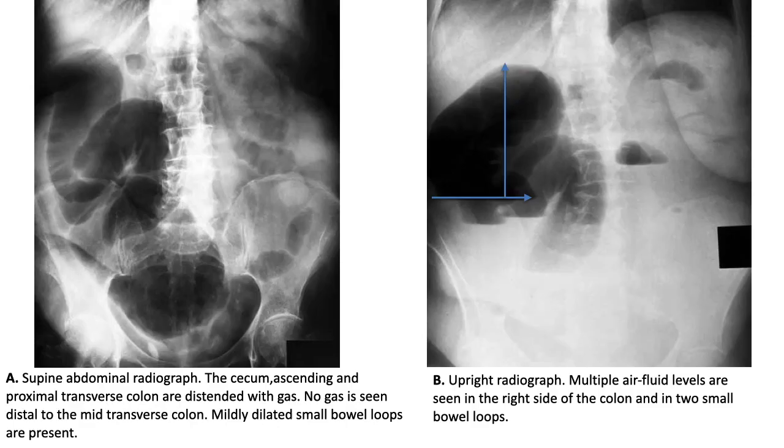Okay, like in this case, you can see the arrow. They are taller than wide. Taller than wide is very important for you to know that. So that's the differentiation. Taller than wide.